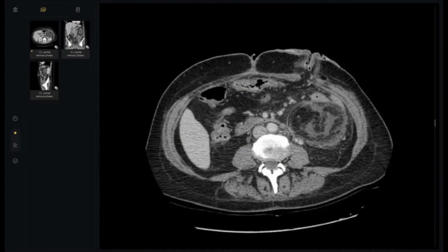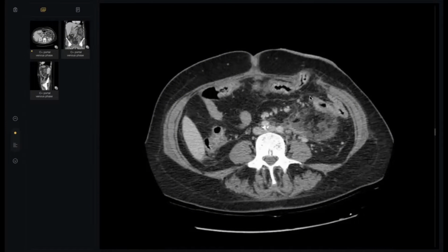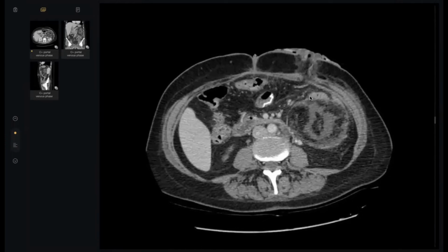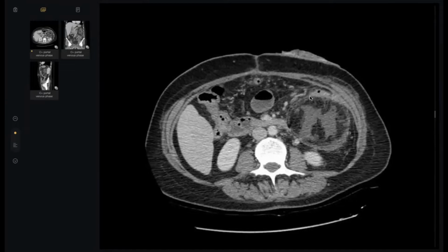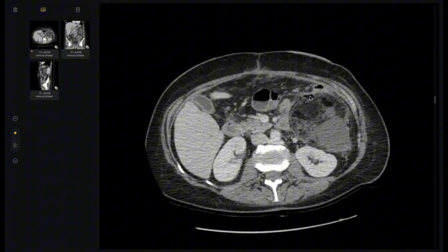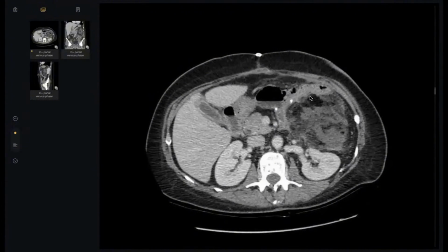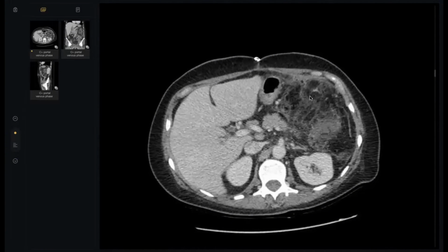Okay, so as the patient underwent an operation 2 weeks ago, and there's an underlying localized area of fat stranding, I think there is then a fluid collection. This may be an intra-abdominal abscess or focal collection, or localized collection. I think there is a focus of air seen.